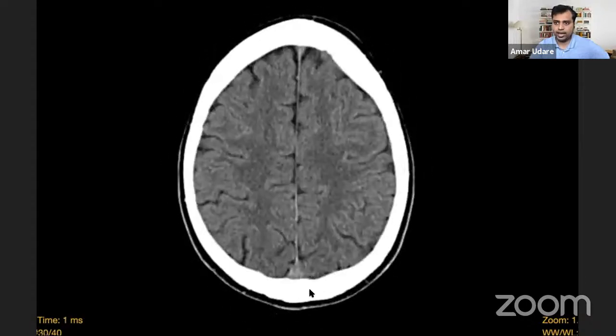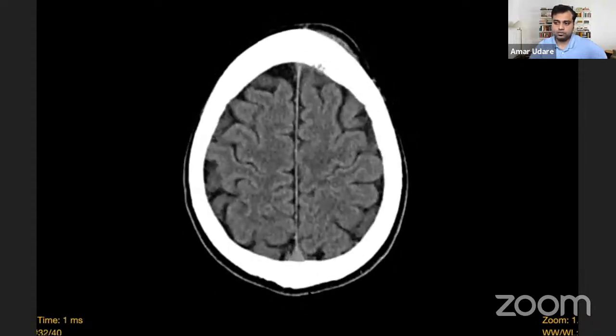So remember the history that I gave you. This patient presented with frontal swelling. I'll pause at the image of interest. Sinus pericranii, that's a good thought. Again, we're looking at significant findings. Okay, so this is the area of interest. Does anybody pick anything abnormal?